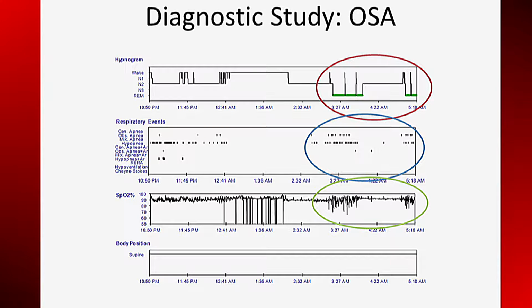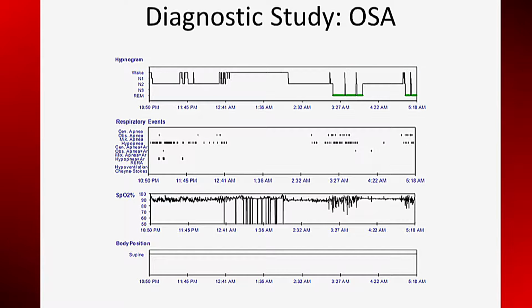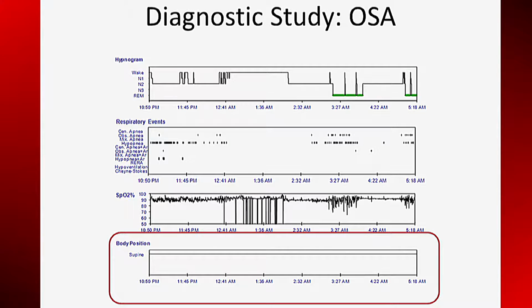Note that oxygen saturation is much worse during REM sleep. Seeing more events and lower oxygen saturation during stage REM is a very common pattern. This patient was supine during the entire study. Body position did not appear to play a role.